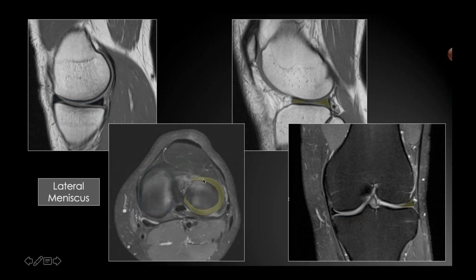The lateral meniscus is a little bit more disc-shaped. It's a little bit flatter in that anterior-posterior dimension, but it still maintains that nice triangular morphology when we're looking at it in these coronal and sagittal slices here. And this gray stuff is actually the cartilage. So you can see how thin it is and sometimes difficult to see. So the bone itself has this nice marrow component, and then we have this thick cortical line. And superficial to that, we have this gray stuff, and this is actually the cartilage.